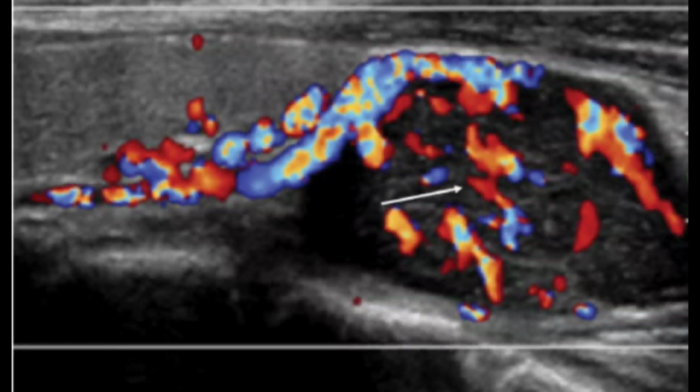On the report you can mention that there is a mixed vascularity within the nodule, but rather than mentioning the mix, it would be better that you separately mention that the thyroid nodule shows peripheral vascularity and central vascularity on Doppler imaging. Mixed vascularity is quite a confusing term, so instead mention whether it is peripheral or central. So mention both peripheral and central vascularity can be found on this nodule, so it is classified as U3 nodule.